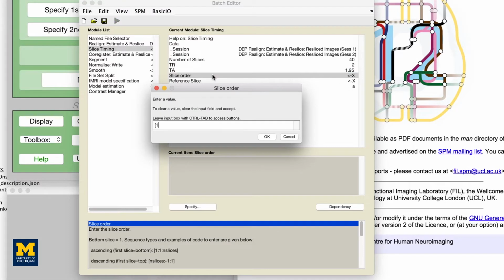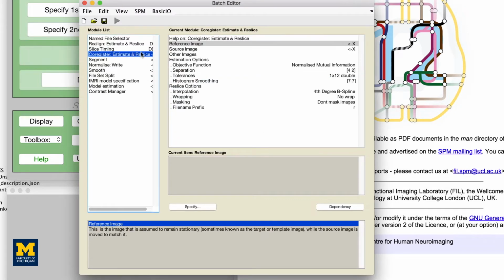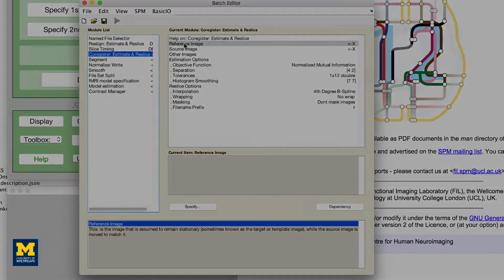The rest of the fields will be filled in just as we did in the previous chapters. The only difference will be specifying the input as a dependency from a previous step. Click on the link to the book chapter below to see details about how to fill in each field.